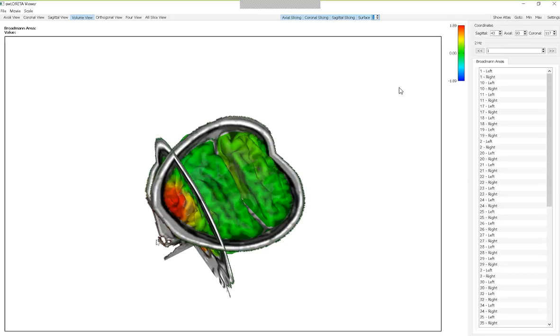There are 12,600 voxels in this particular swLORETA. SW means standardized weighted LORETA, and it differs from regular LORETA by weighting the deeper sources. In fact, right now we're looking at the surface of the cortex, and we can control the depth that we look at. We can actually go down 10 steps in 3 dimensions down to the bottom surface. So this is the upper surface of the cortex, and we can look at the bottom surface of the cortex.